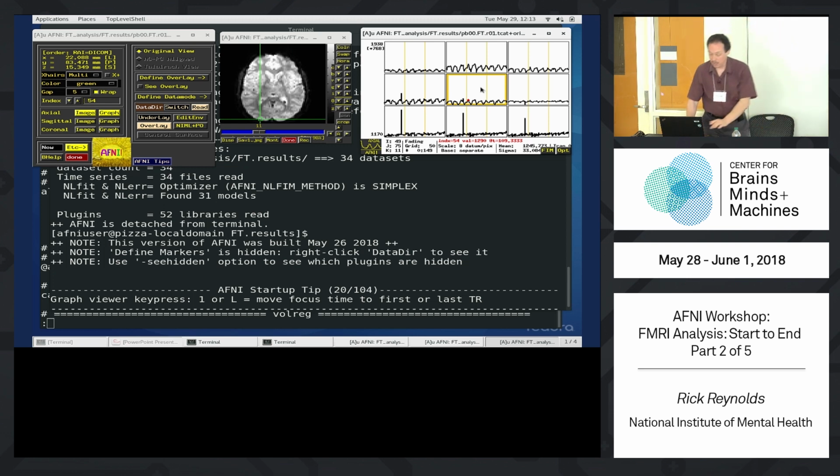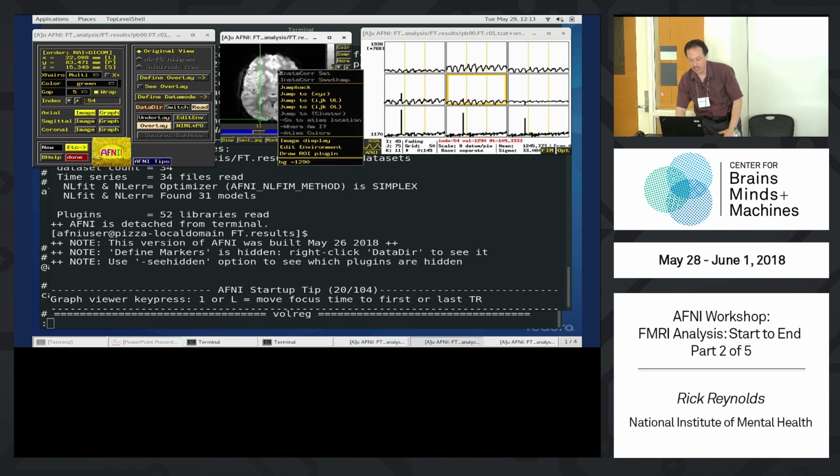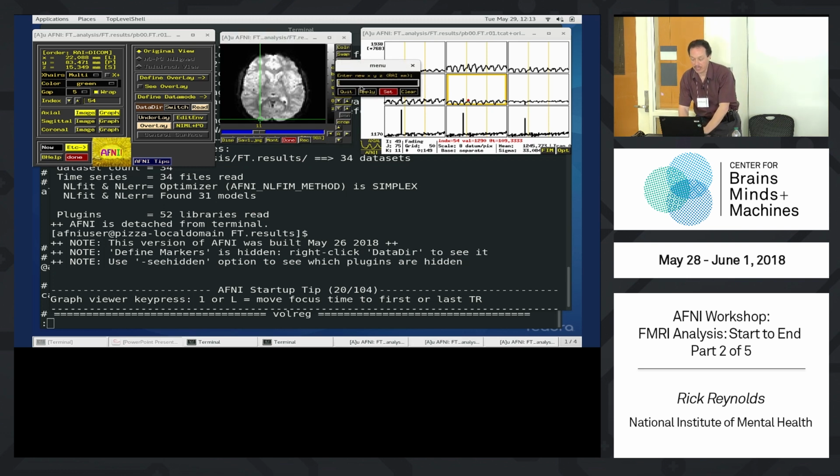Let's all get there. So the coordinates here are 22, 83, 15. So how do we all get there? Well, we can right-click on the image window and get one of those jump tos, right? So let's jump to XYZ. I'll choose jump to XYZ with the right-click over the image window. And then we can type in those coordinates: 22, 83, 15.